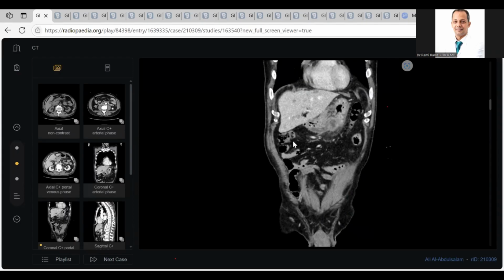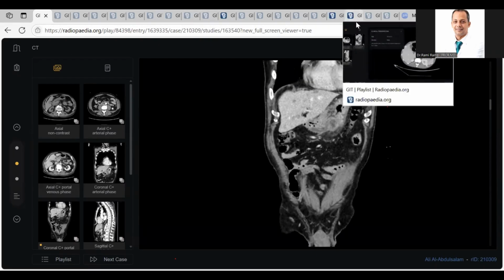Doctor, if I told the examiner it is gastric carcinoma, no problem. No problem. Next candidate, please be ready. Last candidate, please leave the mouse. Leave the mouse because you are still moving my control.